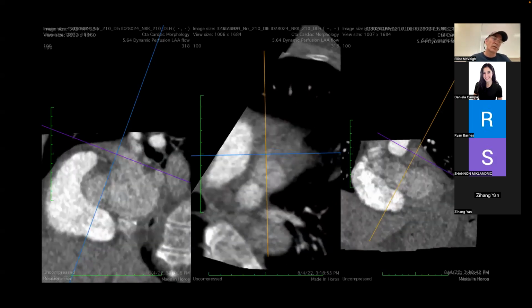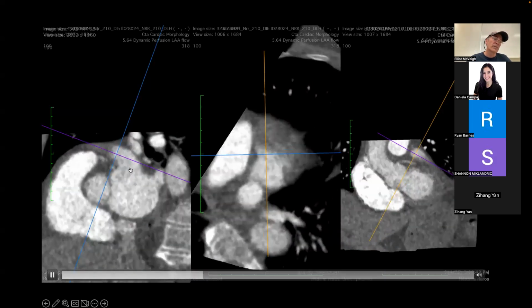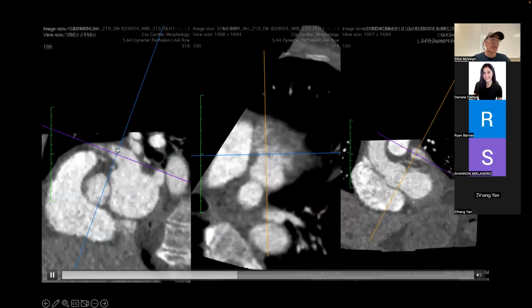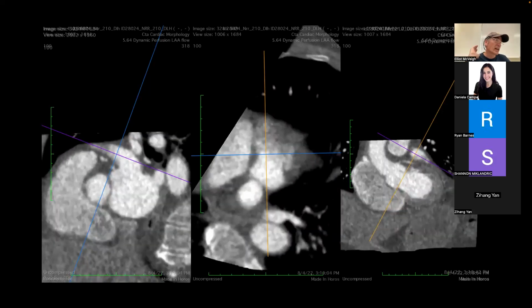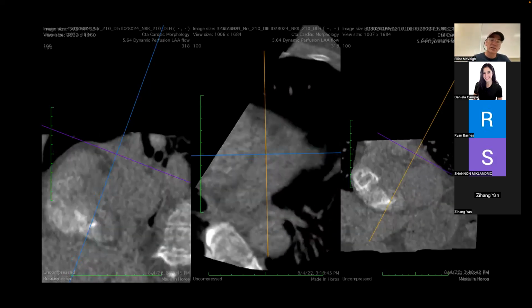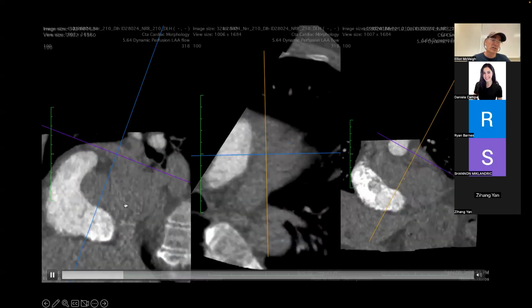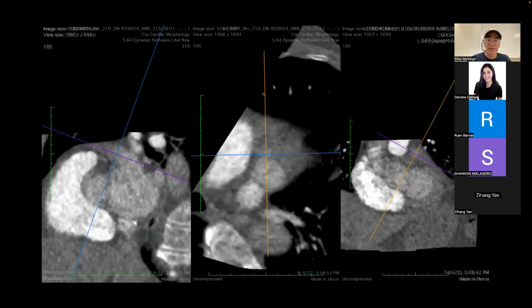So we're working on this to get an idea of what is the residence time of blood at some point in the left atrial appendage. Does it sit there for 15 seconds, or does it go in and out really fast? Some patients, this curve across the whole thing just looks almost like the left atrium. So it just goes in, comes out really fast.